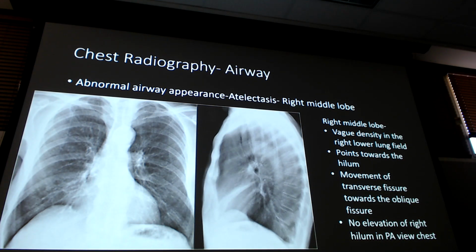Here's a smaller one. Okay. Right middle lobe, atelectasis. See if you can find it before I point it out.